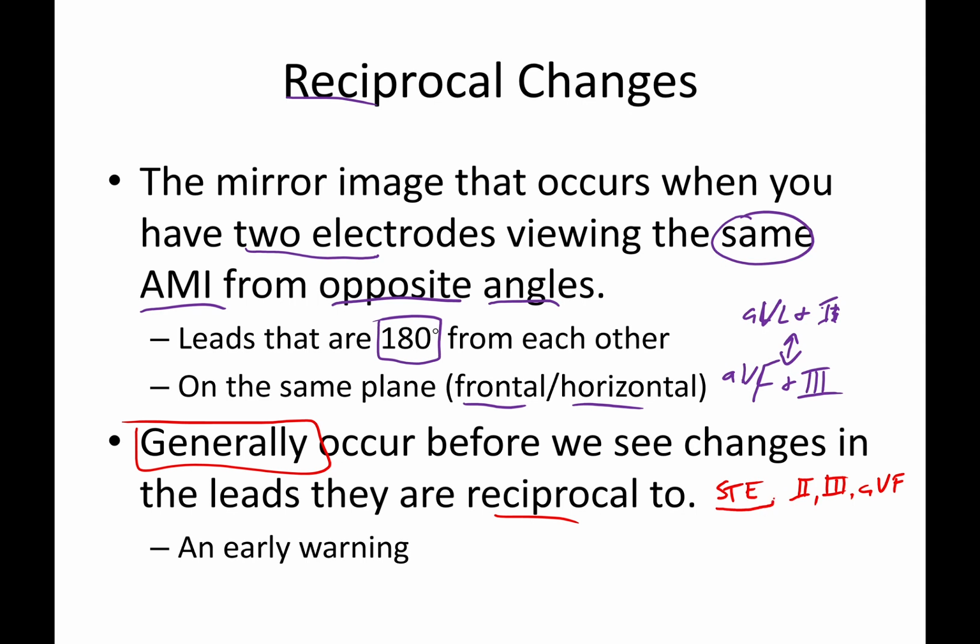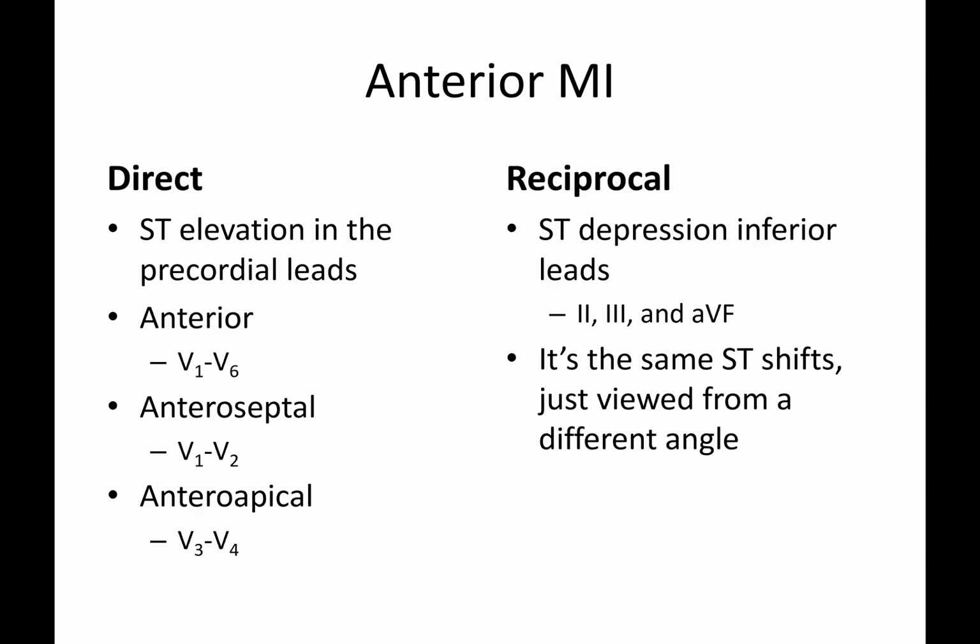Before that really shows up on my EKG, especially if the patient got there quickly, we would actually early on see ST depression in leads 1 and AVL. And so it's this neat concept of when you see that ST depression, that the problem may not actually be in the leads you're looking at, but could be coming in the near future from other ones. And I'll walk through some of the fine points of that.